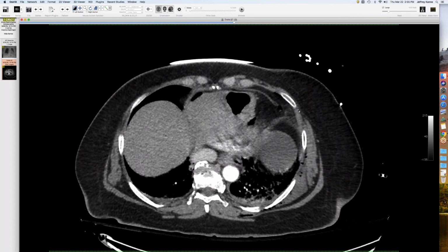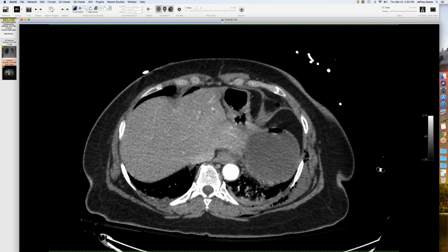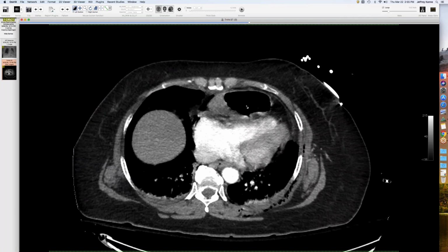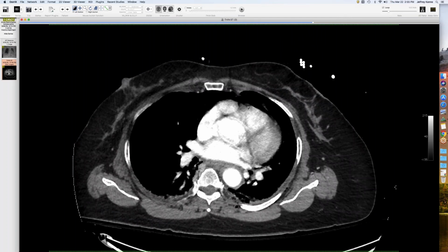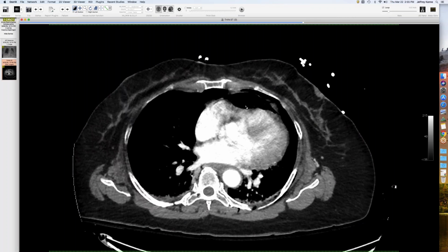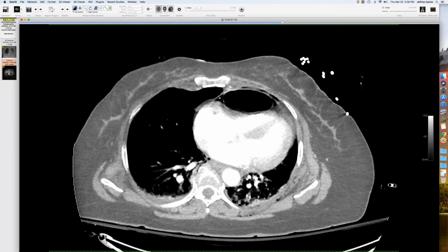And right here is a nice tear in the pericardium. We see some gas, and there's fundus. The right ventricle with some mass effect on it. He's got some other injuries, but this is the main reason I'm showing this. I'm sorry, she. But so this, I think someone showed one of these, I think, at one point. But I've not seen an intrapericardial rupture before.